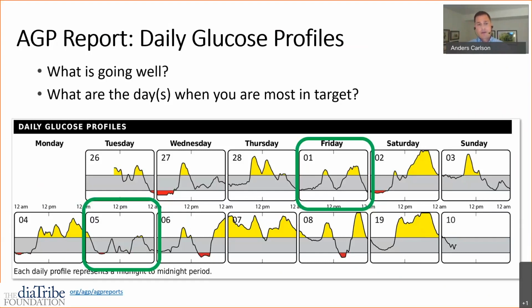And you'll note that neither of those 2 days are 100% time in range. No day will be 100% time in range. That's unrealistic to set for patients. And so at IDC, we've really championed the 70% goal. Time in range is really reasonable for many patients. It's achievable, and it gets to that idea that you don't have to be 100% perfect every day.